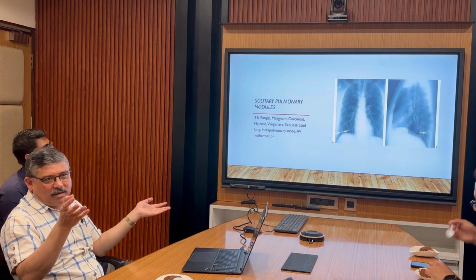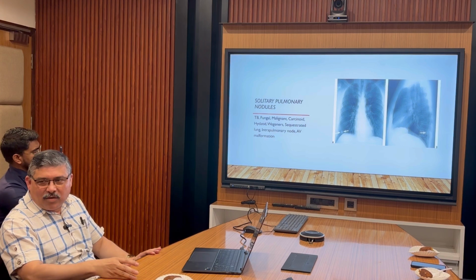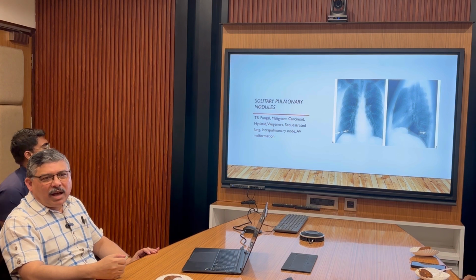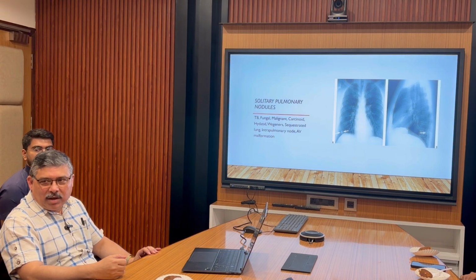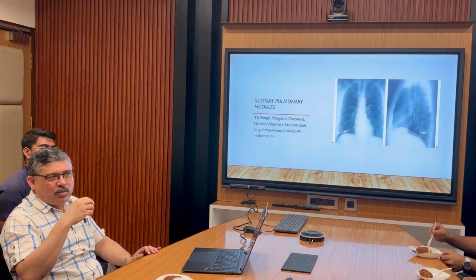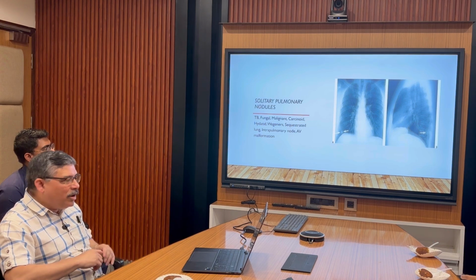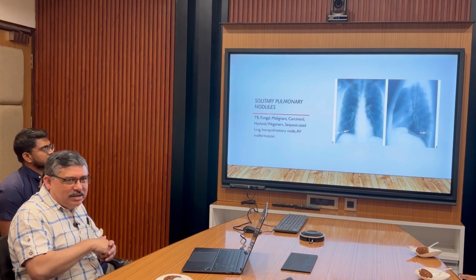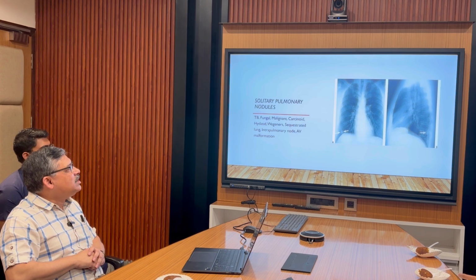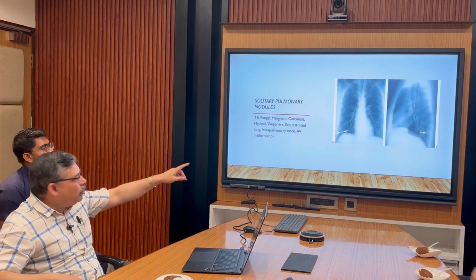This is a very big chapter. Solitary pulmonary nodule is a very big chapter. So there are guidelines in place of how you are going to follow up a case of solitary pulmonary nodule if you find one, and I think you should go through those guidelines. So you may get a question on solitary pulmonary nodule, evaluations, when to see, what are the differential diagnosis, which are the nodules which look dangerous. So these are the causes of a solitary pulmonary nodule. It can be TB, fungal, malignant. You will find it in the book. So this is how a solitary pulmonary nodule looks like, and you will see that the pulmonary nodule is placed posteriorly on a lateral X-ray. Okay, you can make out the nodule, na? It's a small nodule there.